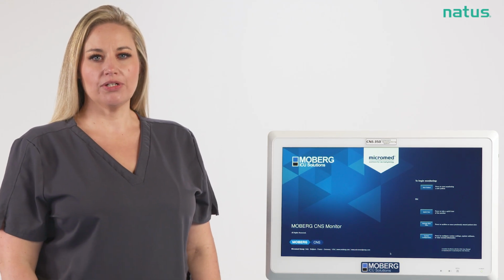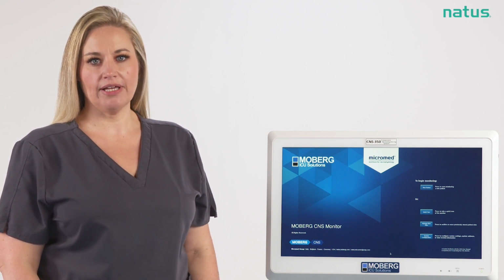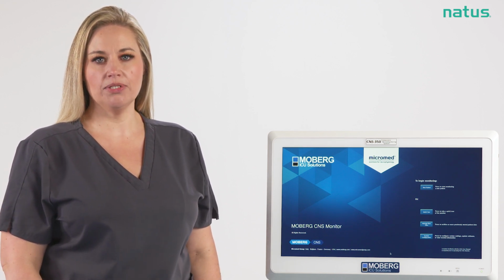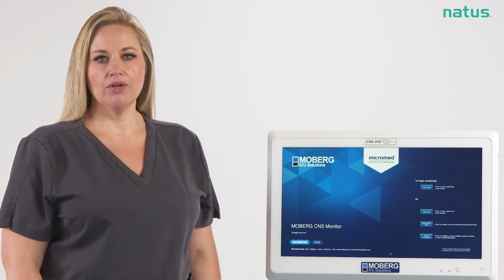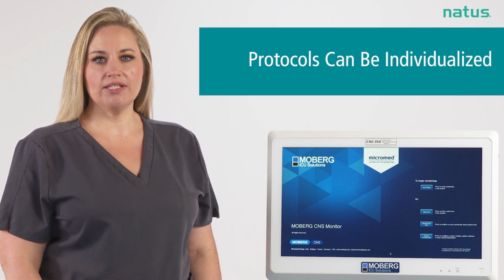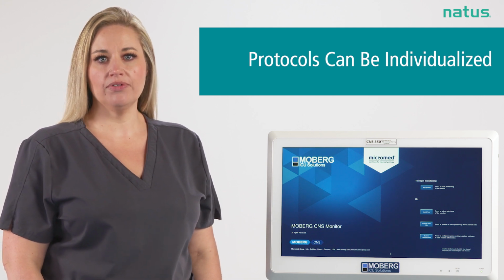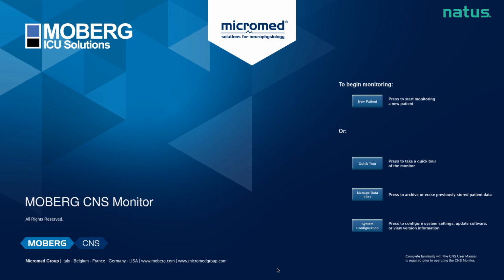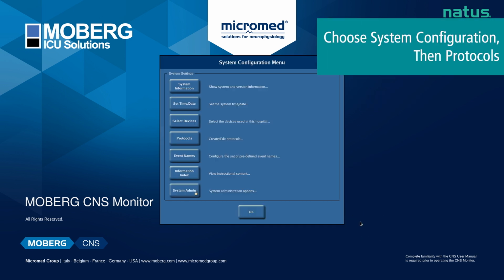As we discussed earlier, a protocol is a configuration setting which contains the measurements you are collecting, the EEG inputs you are using, and how you want all of this information displayed. Protocols can be individualized to a specific research project, a subgroup of patients, or even the provider caring for the patient. To create a protocol, you will tap System Configuration on the main menu and then tap Protocols.